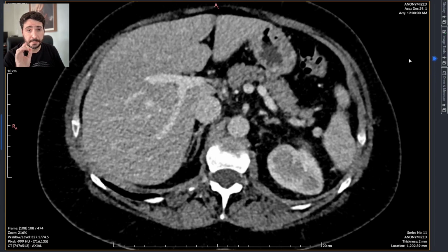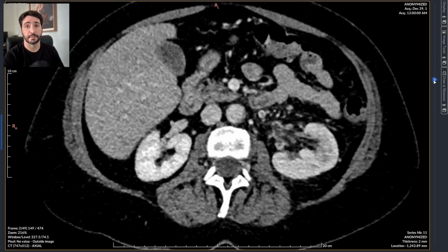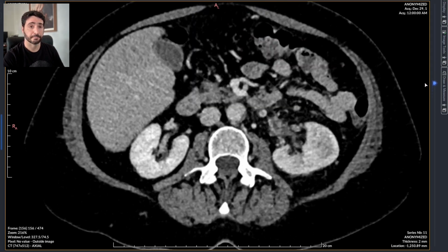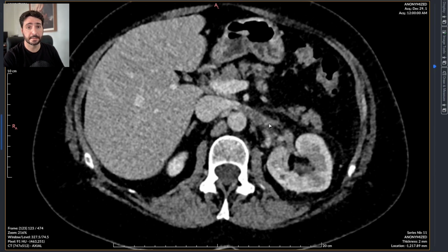But there is something we haven't spoken of, which makes this case much more severe than a regular infection to the kidney, which is by itself a very severe disease. So this is it. You see this and this.